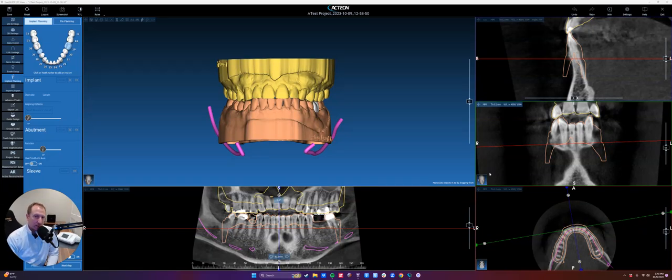Okay, we've made it to the panel where most of the action happens. The implant planning panel is where a lot of planning can happen. There's a lot of options, and we're going to go through all of them step by step here. So we've entered this case where we have upper and lower anatomy. We've done even a wax up tooth. We've mapped the nerves. Now it's time to plan an implant and decide size, shape, and so on, positioning.